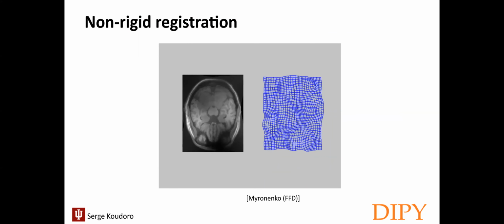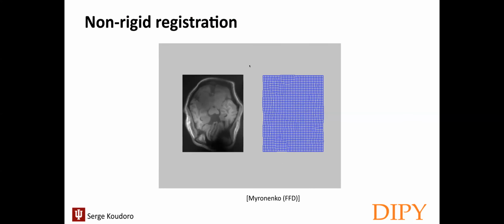As you can see, each region is locally deformed, like we are stretching a paper to obtain the specific field that we want. This kind of deformation is better to accommodate anatomical, physiological, and pathological variability between patients.